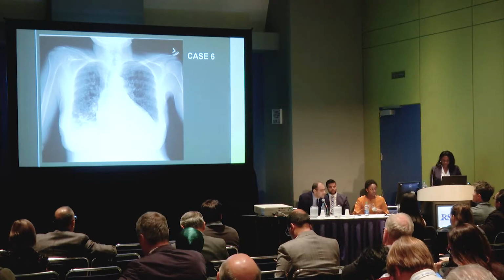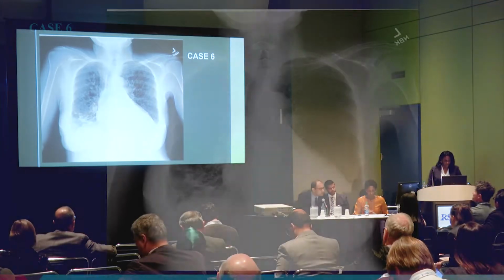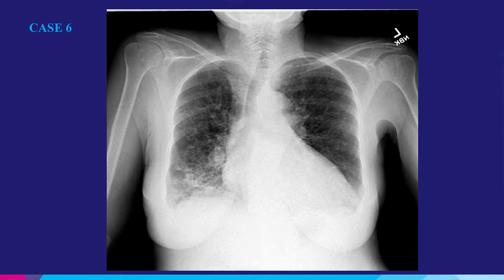Okay, so moving on to case number 6. This is a patient who presented for the first time with shortness of breath, and we don't have results of pulmonary function testing. And this is the routine chest X-ray that we did for this patient.